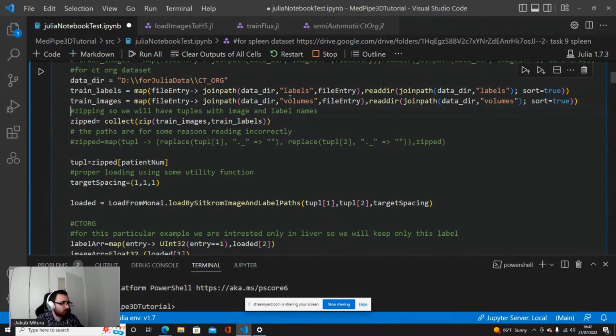Okay, let's go on. Then you zip the paths.